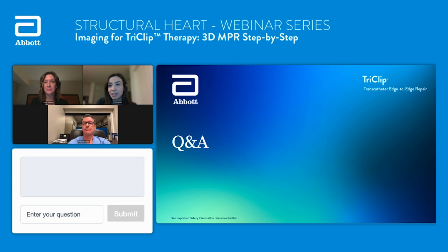Dr. Little, what are your thoughts? I fully agree, as usual. I would simply say that you can't make a good 3D anything from a bad 2D. Sometimes people go to 3D thinking it'll provide some eureka visualization that couldn't be seen on 2D. So my approach to teaching our fellows is, if you've got a really nice 2D image, that's the time you do a 3D. And you learn from 3D, whether it's just a zoomed volume and you want to spin it and manipulate it, add some color, understand the orientation, but particularly in MPR.